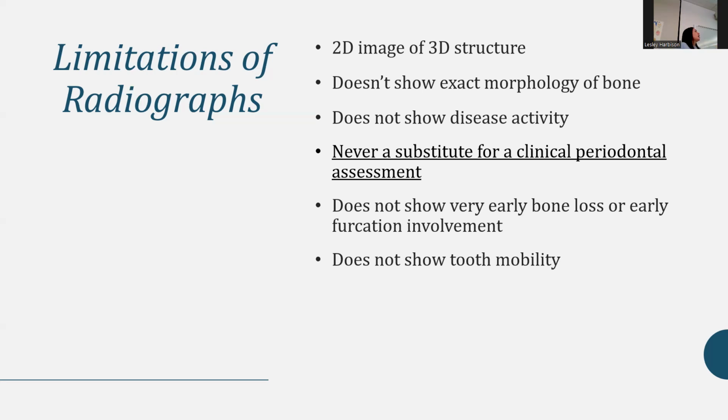Furcation involvement: sometimes the angle that you take the image might obscure the shadow that you might see in the furcation. So your probe is so important for you to run on a horizontal plane from side to side and see if you dip into a furcation. Have you guys hit that part of tooth anatomy, the trunk, that space before you get to the furcation?